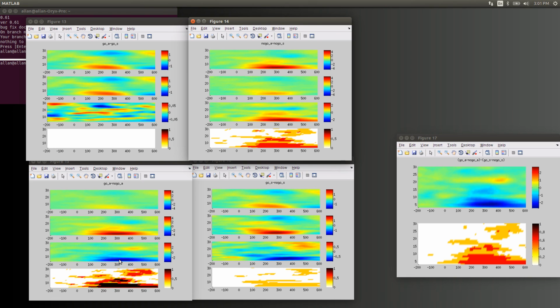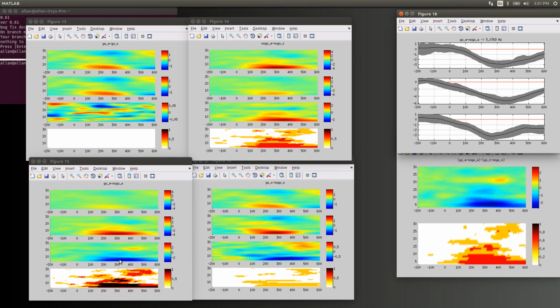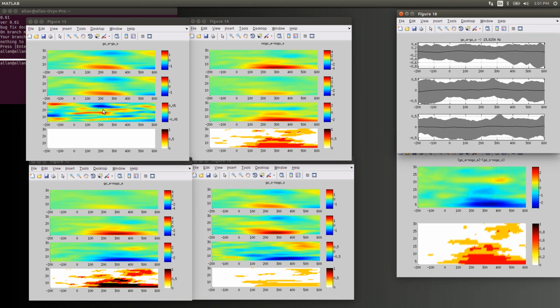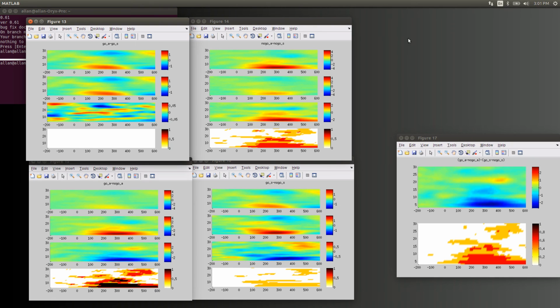Let's click on this difference wave up here, and indeed all 3 subjects, we can see their confidence interval across time at 5 Hertz, and we can see the effect. Okay, but if I were to click, let's say, like here, you can see no subjects are showing a significant difference. So that's consistent.